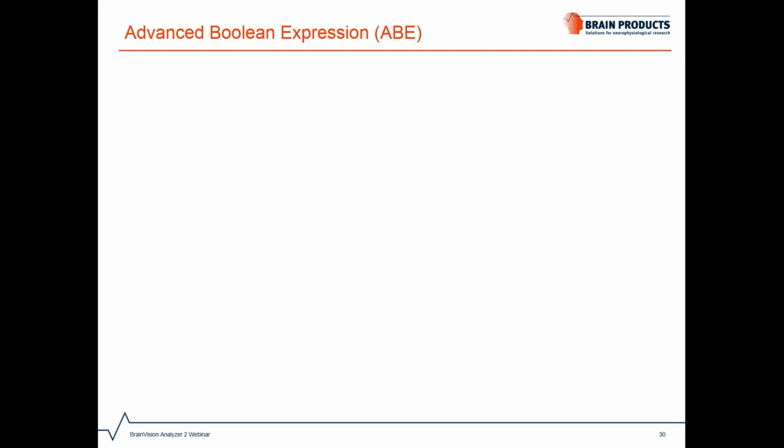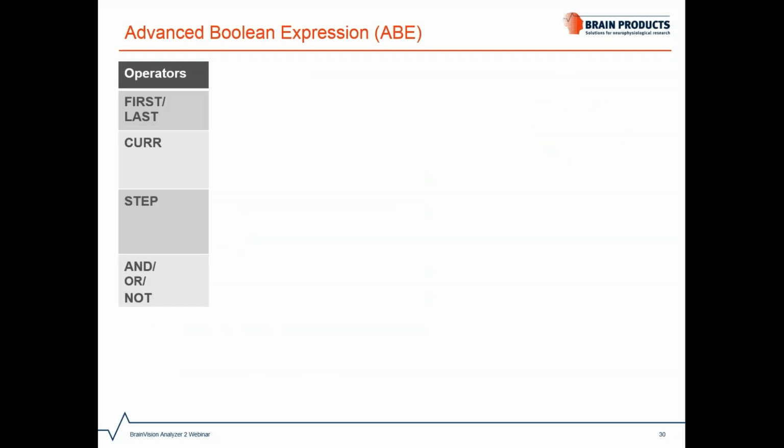Let me show you first the operators that are available. There is first and last, there is cur, which is short for current, and there is step. These all serve to select a specific marker. Also, there are and, or, and not. They are typical logical operators.